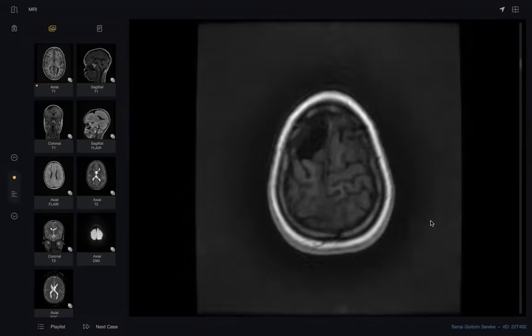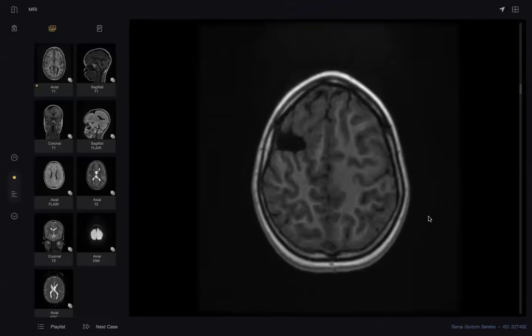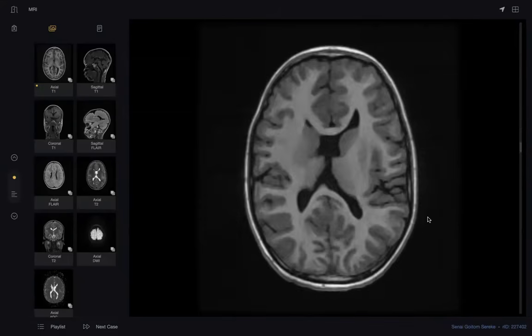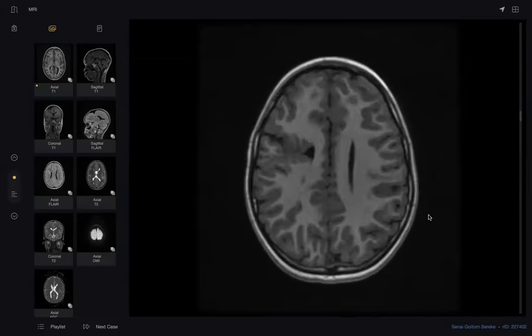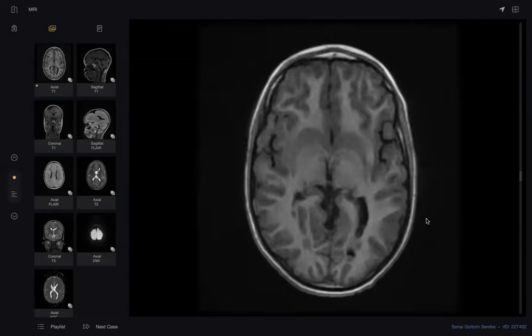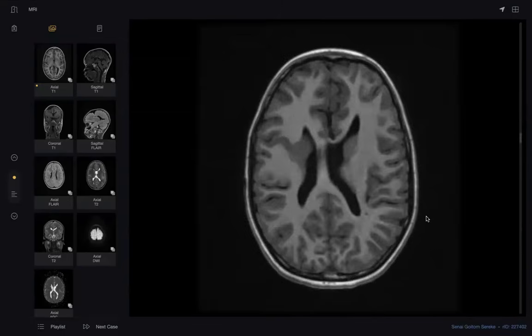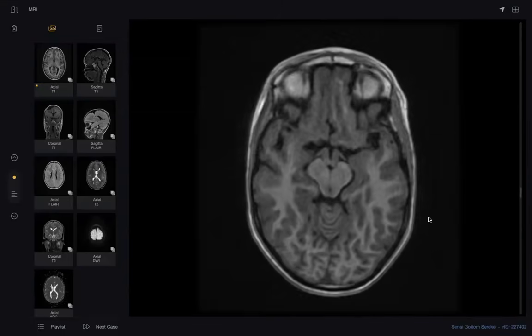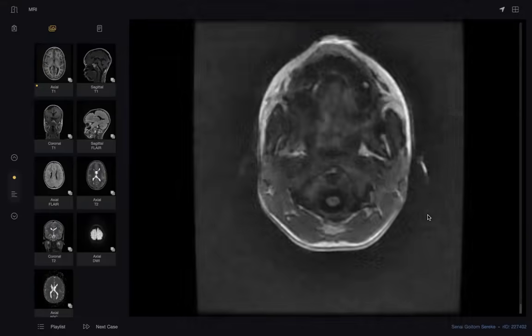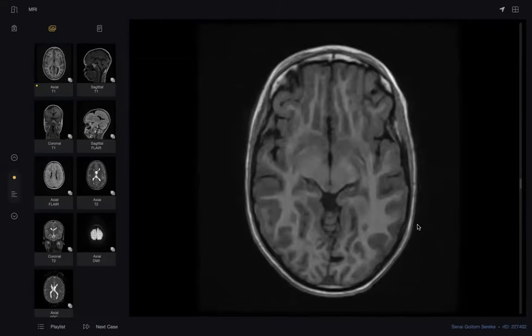On this axial T1 weighted image, there is a cleft-like indentation extending from the subarachnoid space lined with gray matter extending up till the right lateral ventricle. Along with that, there is altered shape of bilateral lateral ventricles, and I cannot clearly visualize the septum pellucidum. There is no midline shift, no mass effect, no crowding at foramen magnum. So to further evaluate these findings, I will go for T2 weighted images.